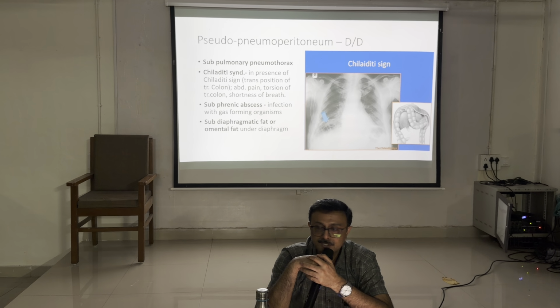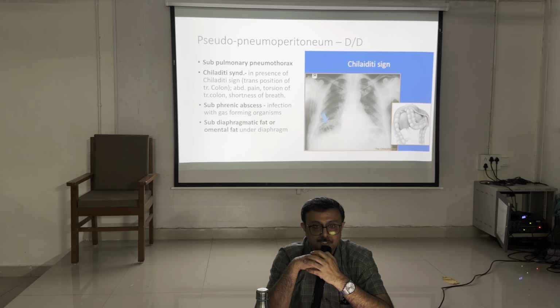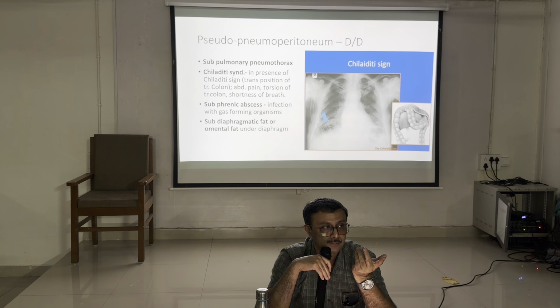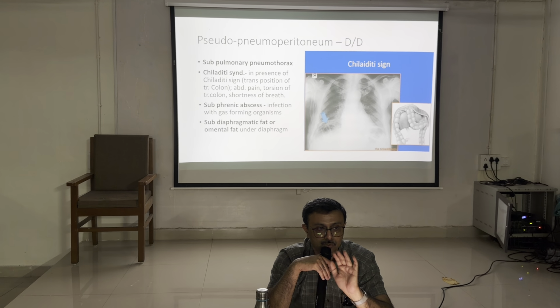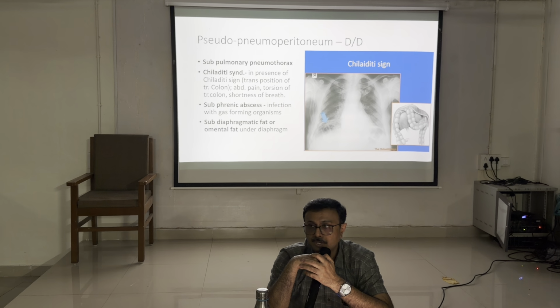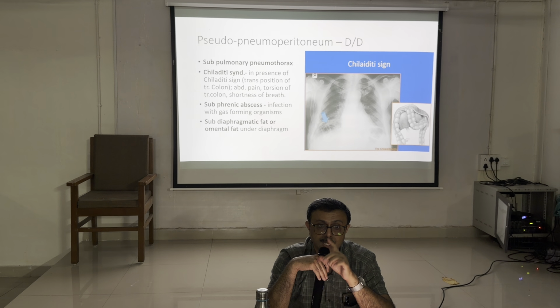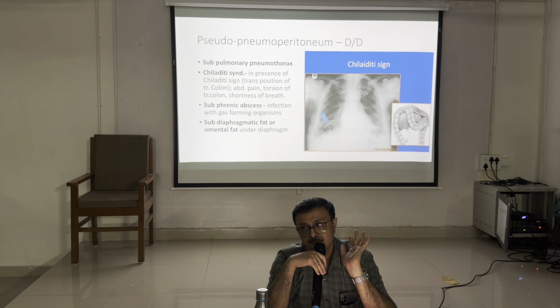So how do you differentiate? It is not crescent shape. It is not intense black. It is confined gas. Outside gas is pure gas, so it is intense black, but inside the bowel wall is also there, so the black color is also there, and it is not intense black. And it is not crescent shape. Luckily, if haustration is present, you can identify it as colon.